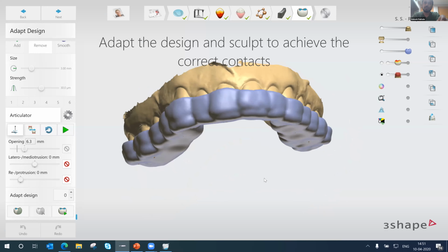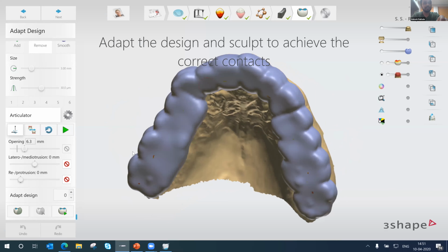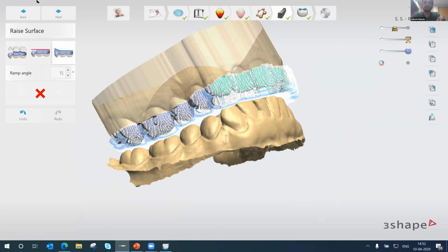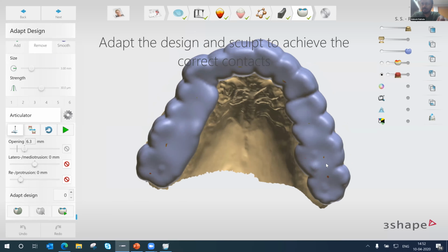But let's do one thing. I would just go back and change it to a higher division, which would be easier for me to make you understand how it happens. Okay. So here, all right, let's take a look. I'm sorry for that. Now you can see these spots, which might get cut when I apply these settings.